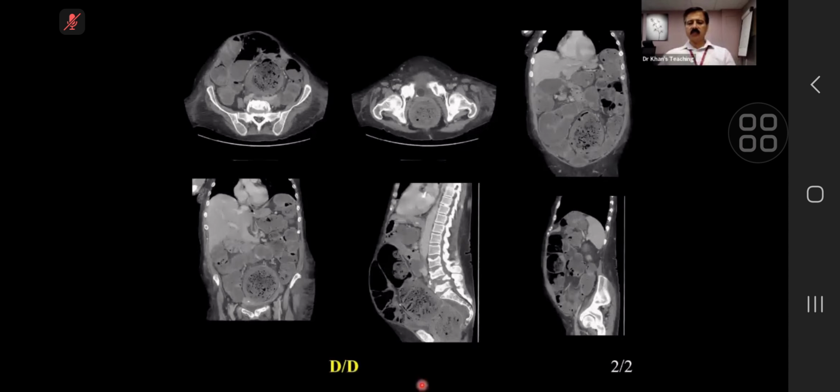So this is the CT scan. Unfortunately, I have not given you, let's say, the recto-anal canal junction. Having said that, everything is dilated. There is no pneumoperitoneum in this case. What will be your conclusion?